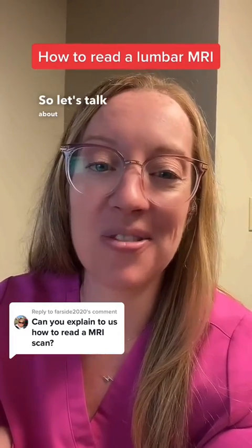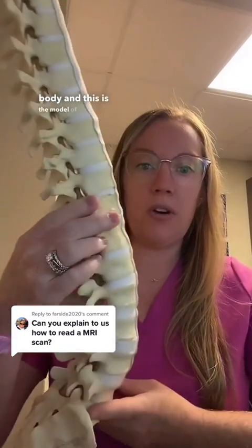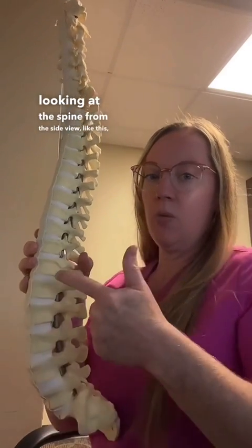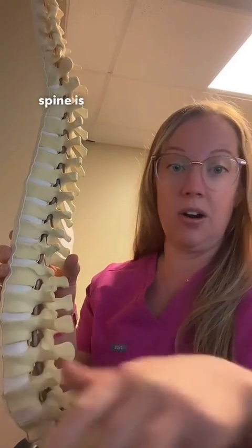So let's talk about how to read an MRI scan. I explain how to read MRIs based on how the spine lies within our body, and this is the model of our spine. If we're looking at the spine from the side view like this, what we're able to see is the bones and the disc, and then what runs through the center of the spine is the nerves.